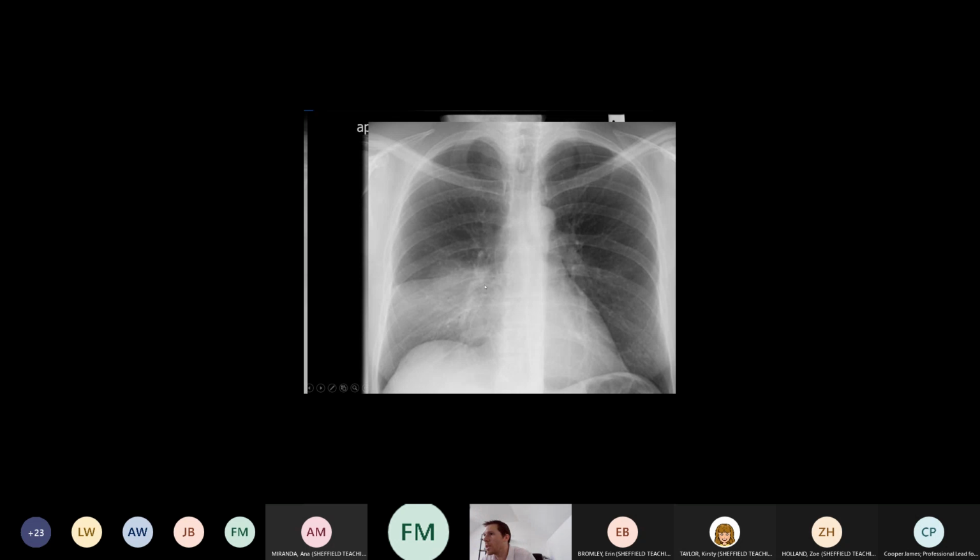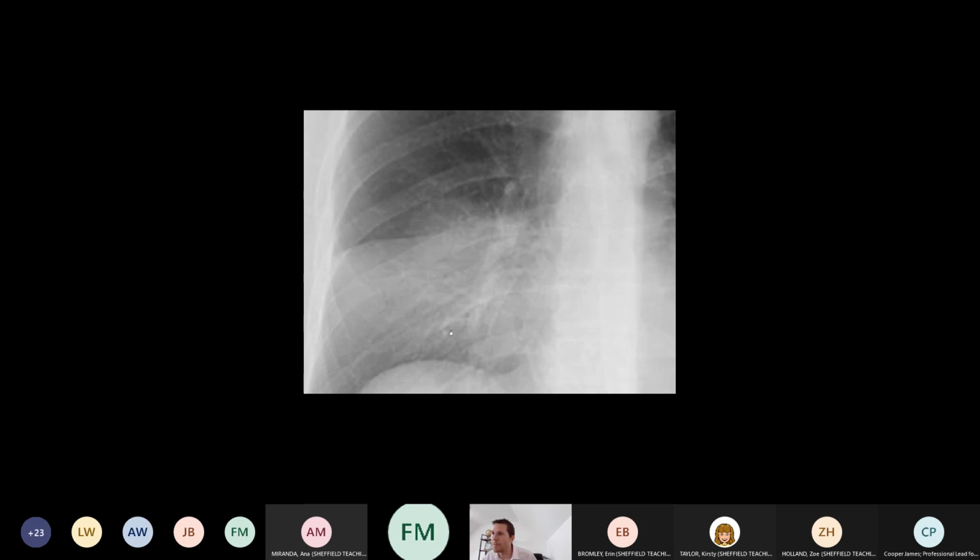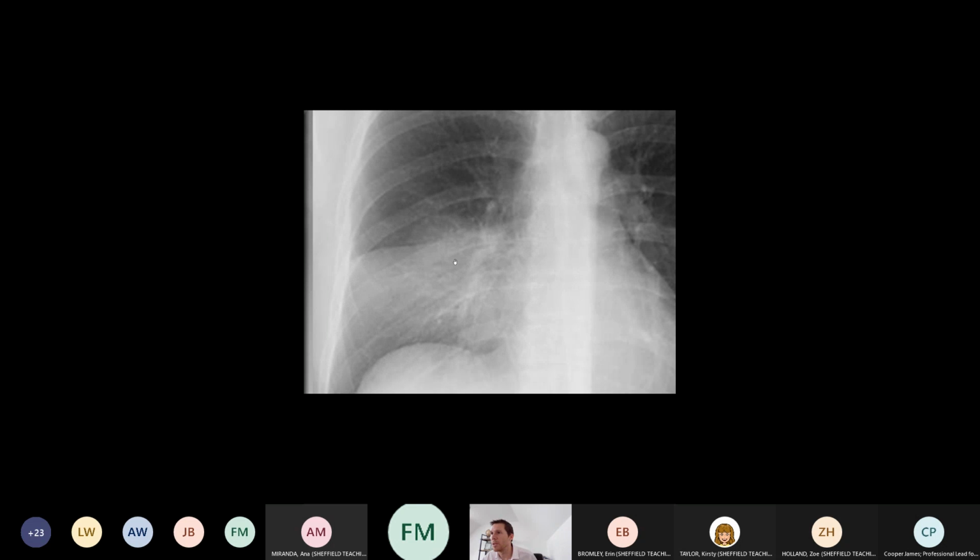If you fill all these alveoli with fluid, which is what we've said consolidation is. So with consolidation, you fill these alveoli with fluid, you then create an interface between the alveoli and the bronchi and the bronchioles. So here, can you see these little black lines? I'll zoom in. These black lines here. A bit low resolution, unfortunately.